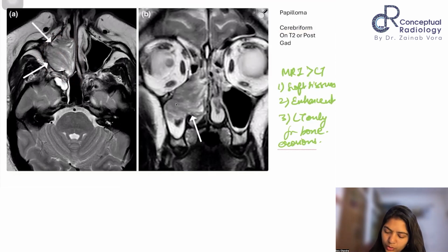Now, important thing to note here is all the bony lines are intact, right? How do I say on MR that the bones are intact? So it is kind of an extrapolation because all these T2 dark lines, these are the cortices of the sinus walls, bony walls. And we see that this particular lesion has expanded the OMC. That is why I keep saying that you have to see the drainage pathways always. As soon as there is an expansion of any of the drainage pathways, and yet it is obstructed.